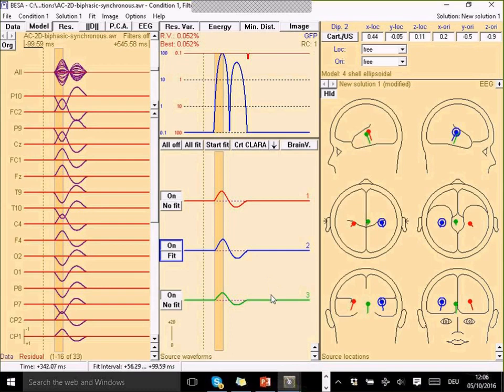And this is not quite true. You can see now that there's still some activation of the third source. And the reason for that is that there's a thing called regularization that is applied to the inverse operator. So we smooth this inverse operator a little bit, and this results in some leakage of activity from the two sources to the third source.